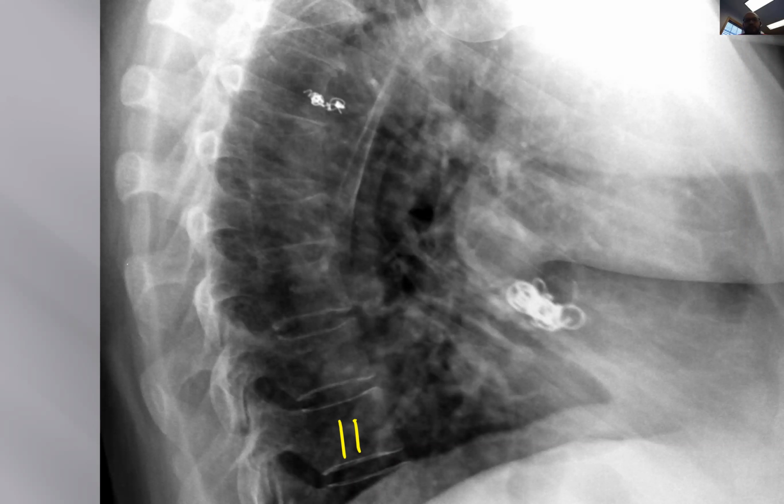7. 7, so 11, 10, 9. Did I have a guess for 7? Yes. Okay, we got a guess for 7, so 11, 10, 9, 8, 7. Any other guesses? 10, 9, 8. Number 8 is one you're on there. Okay, number 8. We got a vote for 7. Good job on muting yourself, guys. Anybody else want to throw a guess? We got a vote for 7 as being abnormal and 8 being as abnormal. Which other guess? Anything else?